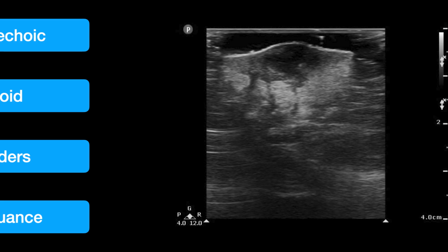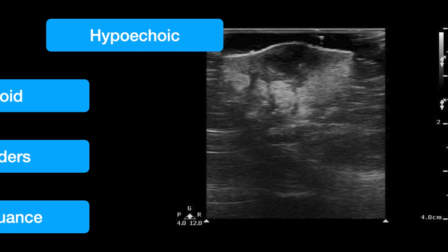So the first thing here, here's the image. Here's an abscess. The first characteristic of an abscess on the ultrasound is basically this hypoechoic core, right? I've seen this look a number of different ways over the years that I've done this, but generally you see this core, this nucleus of inflamed tissue, and I've seen it range all the way from anechoic to decently isoechoic. It could be anywhere in there. But what you see in that core is generally something that's less echogenic than the surrounding structures. Generally, you see a complete loss of the architecture of the normal skin. It's just some lake of liquefied material, essentially. But it's going to be the hypoechoic core. That's going to be our characteristic number one.